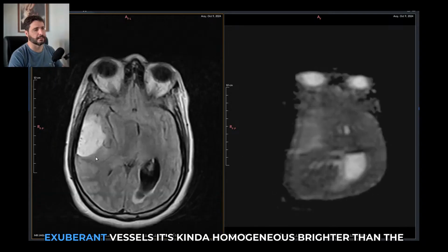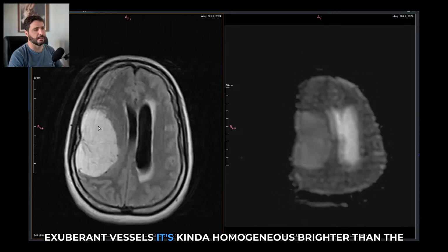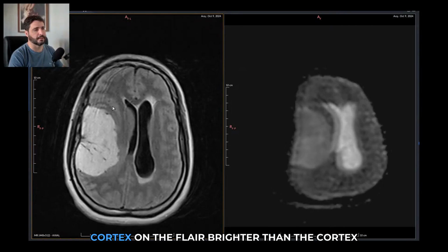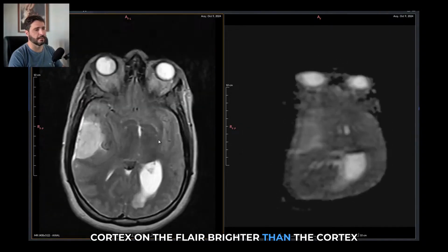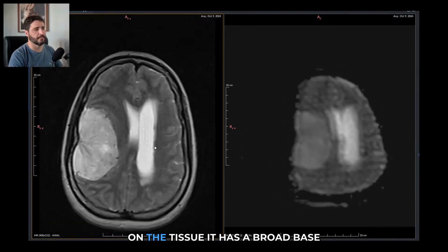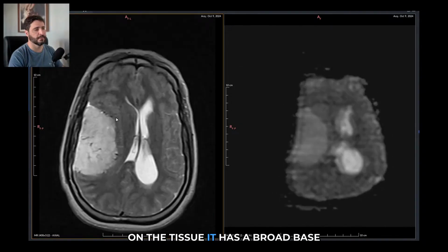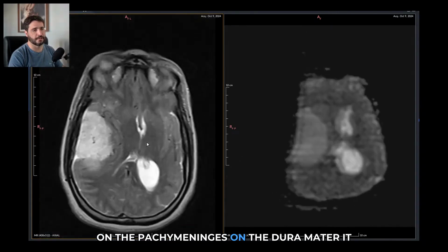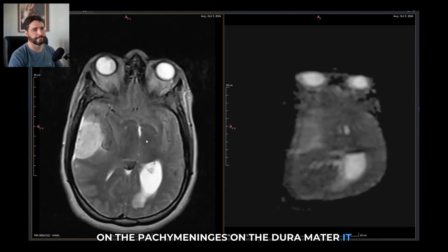It has exuberant vessels. It's kind of homogeneous, brighter than the cortex on the FLAIR, brighter than the cortex on the T2. It has a broad base on the pachymeninges, on the dura mater.